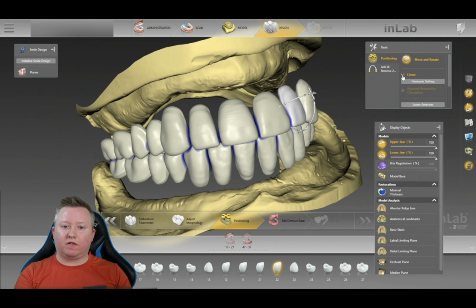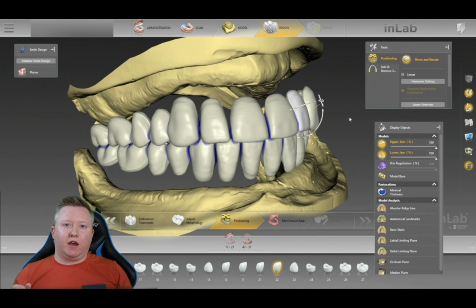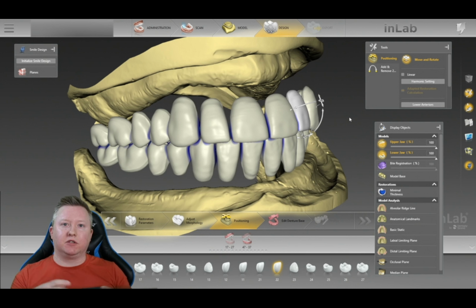If it's not in a linear fashion in terms of movement, the software is actually trying to scale those denture teeth to fill that gap or that setup area that you're trying to adjust, as well as move them at the same time. So the problem with that, when we're dealing with denture teeth that are pre-occluded and we're ordering, is that they cannot be trimmed, and they're not going to be trimmed, right? Unless you're using two-step milling. But that's a completely different workflow.